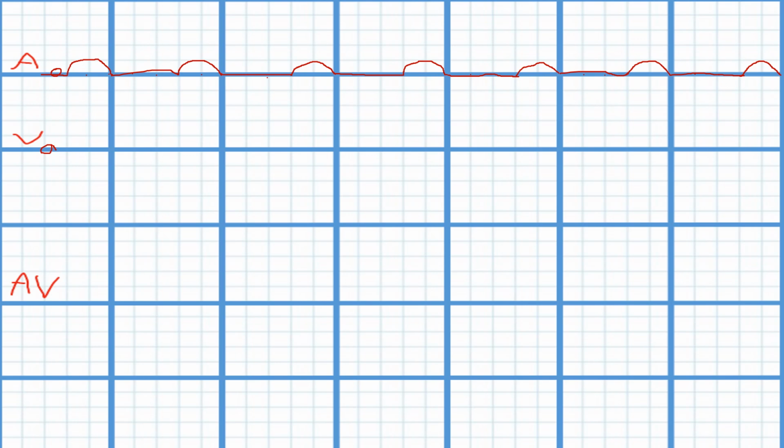Okay, so now let's say that my ventricular activity, I'm getting 1 wave instead of every 5 little blocks, I'm getting 1 wave every 8 little blocks. And we'll just offset this a little bit just for the sake of fun. All right, so we'll do 1 little block down. We'll do 4 little blocks above 0.